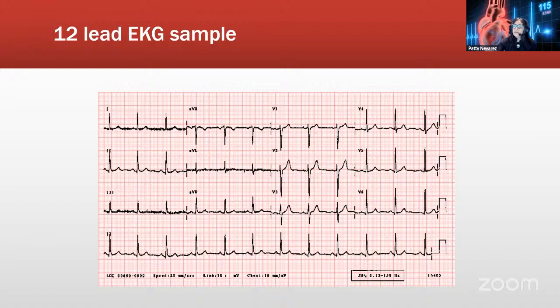On this 12 lead EKG example, the first way to identify the heart rate in an EKG is going to be the 6-second rule. For a 6-second rule, we have to have a 6-second strip. And like we said before, if we only take lead 1, it is not 6 seconds. The only one where we have 6 seconds of information will be the bottom lead, which is lead 2.